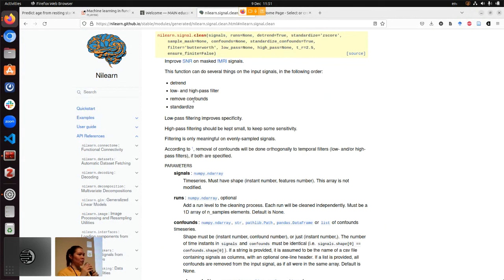For example, when we are looking at brain activity, people are mostly interested in the recording in the gray matter. But in the brain signal, we don't just have signal from the gray matter. We also have the white matter. We have some spinal fluid and all that kind of things. And they can all interfere with the activity recording of neighboring brain regions.